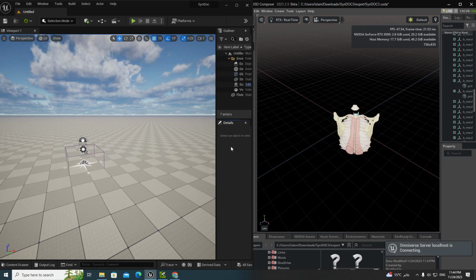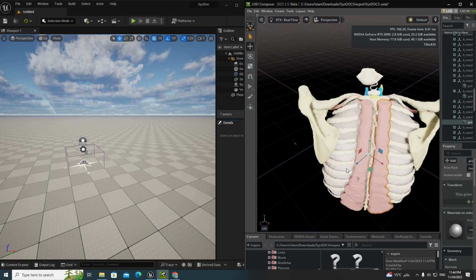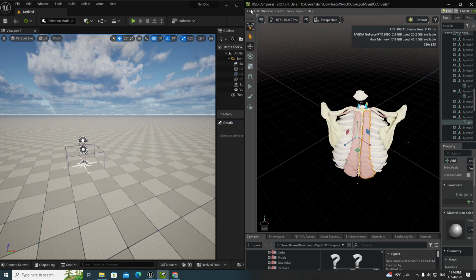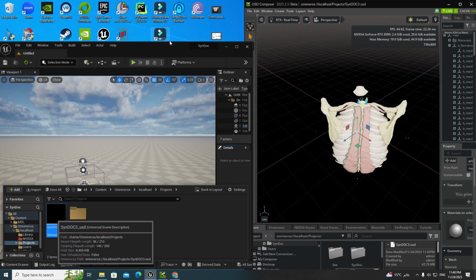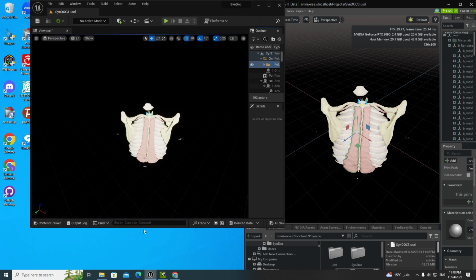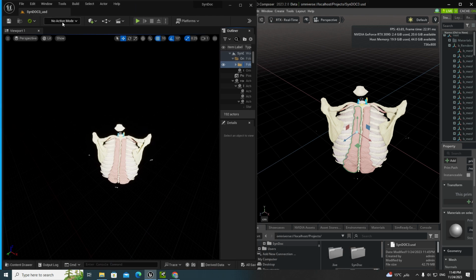Local. Okay, it's okay. Make it live now. I must save this one, and this I didn't do. Save as USD3, and here it is. This is the second session, and we make it live.